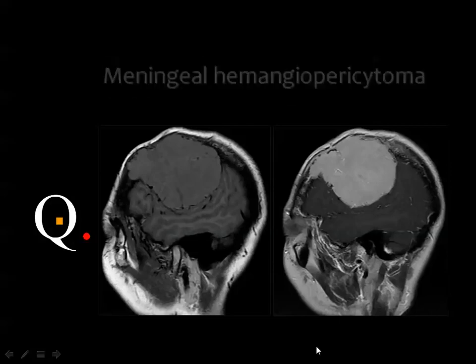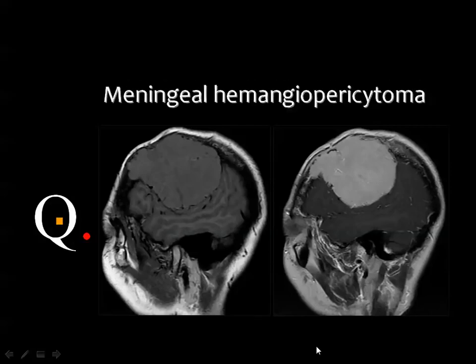I said that aggressive meningioma is not usually used in this category, but you may say that this is hemangiopericytoma, which is one of the tumors arising from the meninges with aggressive characters, and it is commonly seen in males of relatively older age. You can see the CSF cleft sign because this is an extra-axial pathology.